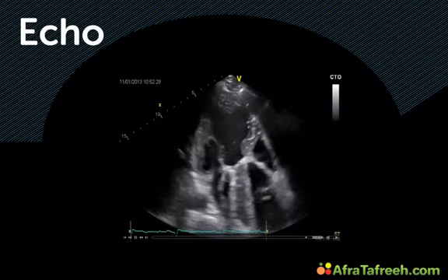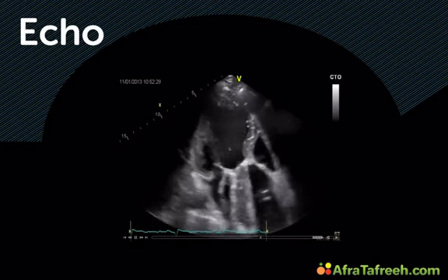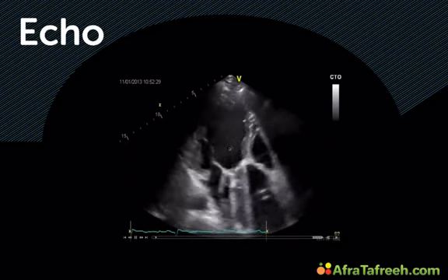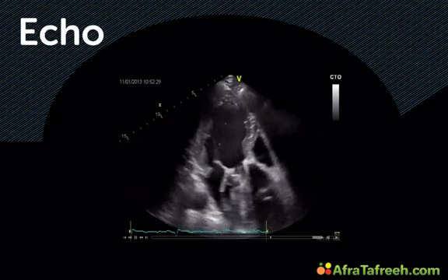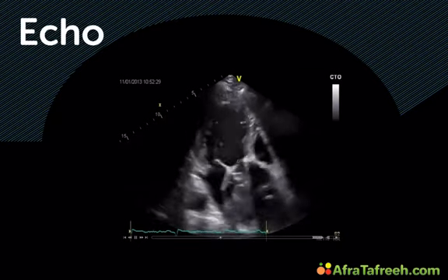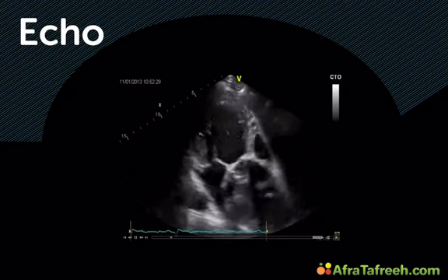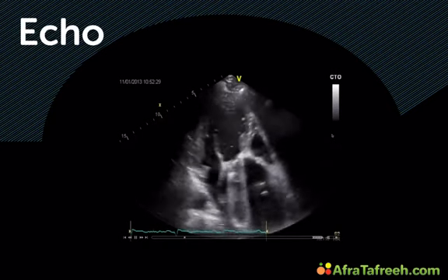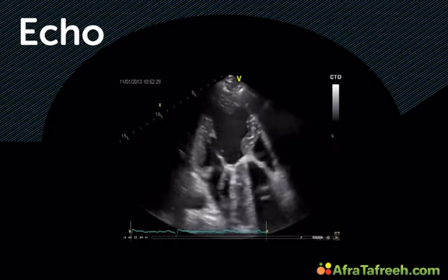It's a phenomenon associated with the physics of ultrasound and the mechanical strain on the red blood cells, which causes little gas explosions. You might have more of these gas explosions or cavitations if patients have some form of dysfunction of the prosthesis, which was not the case in this patient, however.